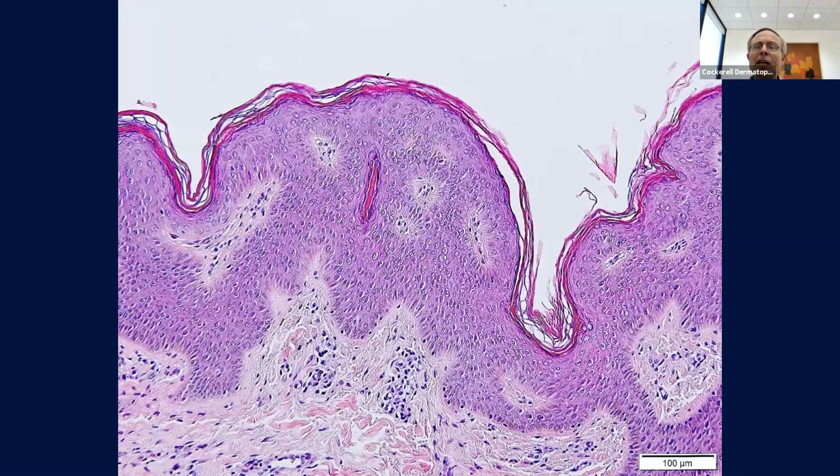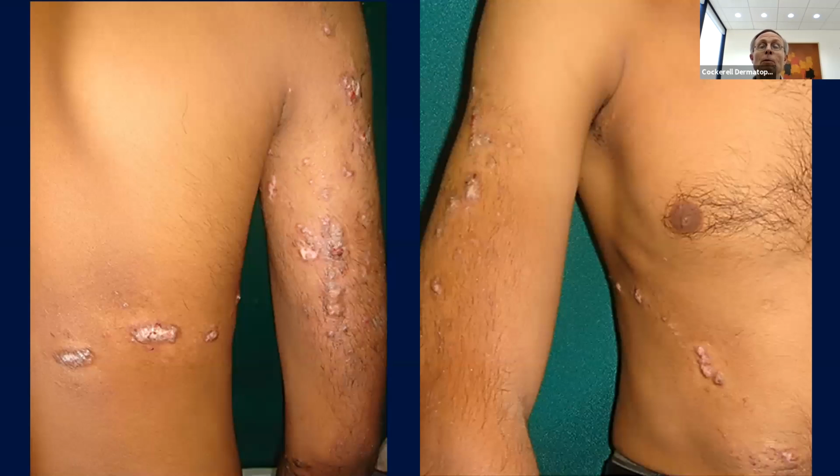Epidermal nevi can take a lot of different forms. They can look like this. They can look like a seborrheic keratosis. They can look like warts. They can look like psoriasis with psoriasiform hyperplasia. Inflammatory linear verrucous epidermal nevus, which clinically is what this could be here, generally has these broad plates of parakeratosis that alternate with normal psoriasiform hyperplasia of the epidermis, but without the parakeratosis. So it's kind of like a clonal parakeratotic process.